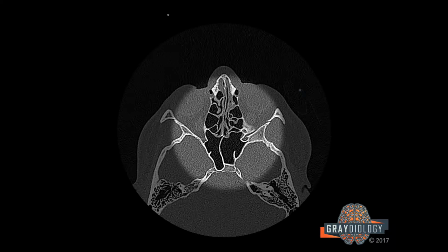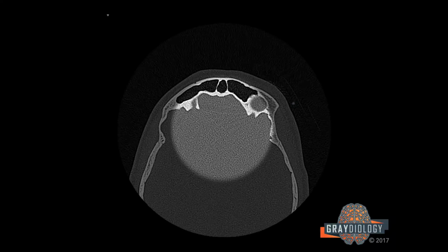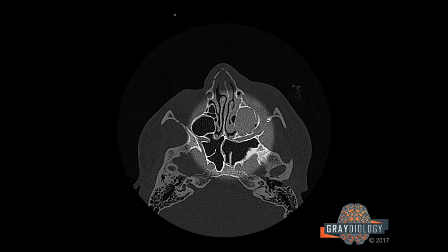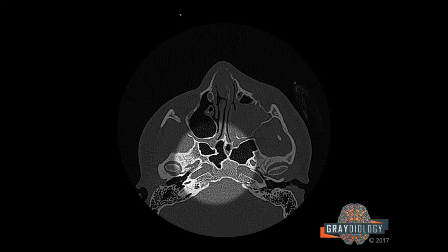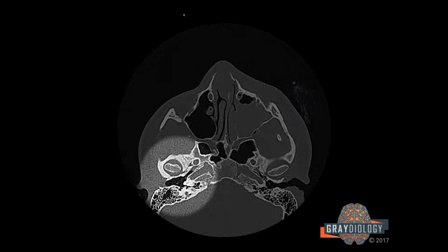Then I come back up, again following the pattern I established in the CT head. I look at the anterior skull base, left middle skull base, specifically the foramen ovale and spinosum, right middle skull base, specifically ovale and spinosum.